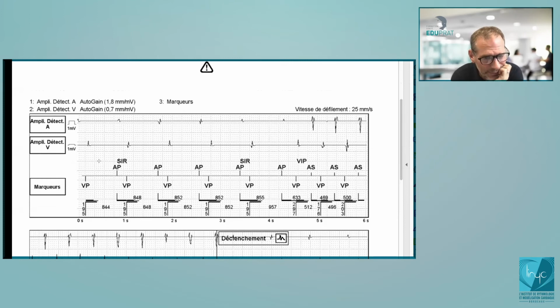And you see here a patient with APVP, 200 milliseconds. That's the nominal value for the paced AV delay, 200 milliseconds. And what you see here, VIP. It will try to find an intrinsic conduction, and it will prolong here, you see 100 milliseconds on 1 beat. The problem is that there are two limitations with long AV delay. The first one is the 2-to-1 block during exercise, and the second one is the risk of PMT.